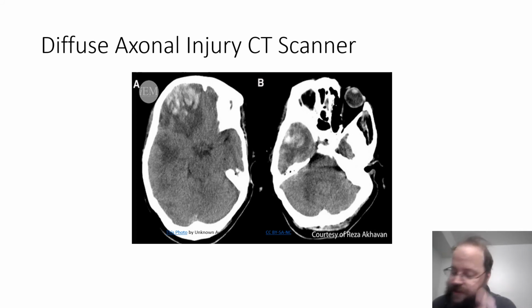We talked about the insula in our short video about patient awareness of deficits. This patient most likely would have problems being aware that they have disabilities, and there's extensive tissue loss both in the right and the left side. So this tells you, again, this is an older injury.